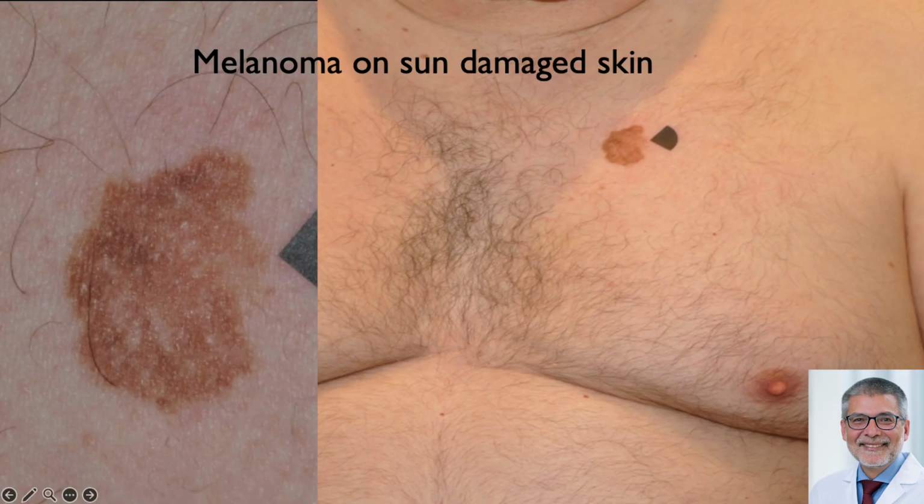So here is a pigmented lesion on the chest of this older gentleman, sun-damaged skin or chronically sun-exposed area of the skin. Obviously, you clinically already know that this is something weird, right? I mean, this has irregular borders, it's large, and it's not been there since birth, so it's an acquired lesion. So on the clinical level, you already should be suspicious of the diagnosis of melanoma.